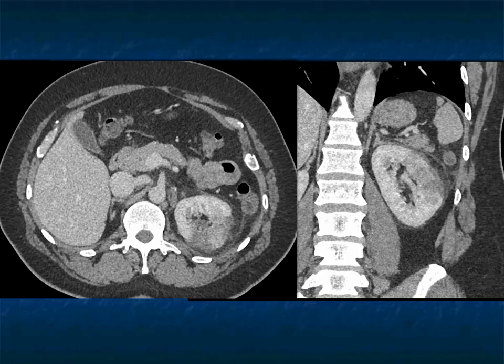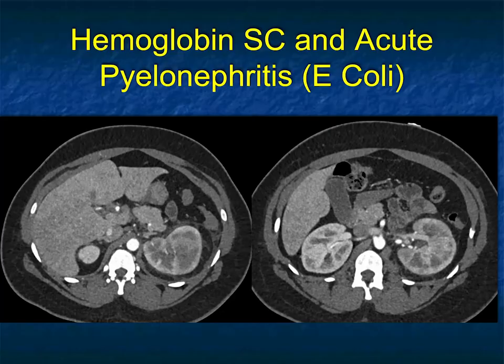Yes, with infarction, you may see thrombus in the renal arteries, but often you won't because there'll be small emboli to the kidneys. But with infarcts, they're usually a lot sharper. Here, the stranding as you go to the venous phase at about 70 seconds. You can see the stranding laterally, the stranding in the kidney, and this is a good example of infection.